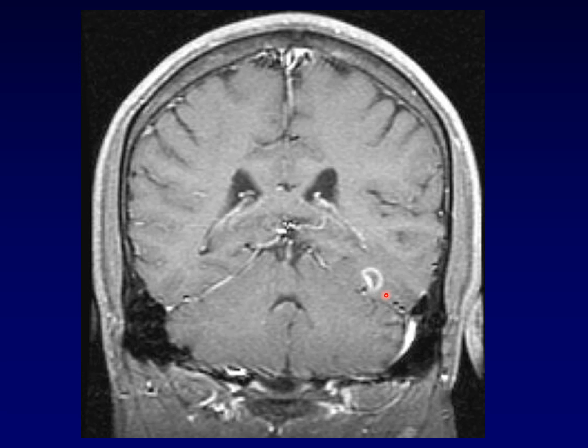There are a lot of things that cause enhancement within the brain. Tumors can cause enhancement. Infections can cause enhancement. There is a long list of abnormal things. This one happens to be an infection that occurs almost exclusively in patients who are immunocompromised by HIV. This is toxoplasmosis, and this is a little abscess of toxoplasmosis in the temporal lobe.